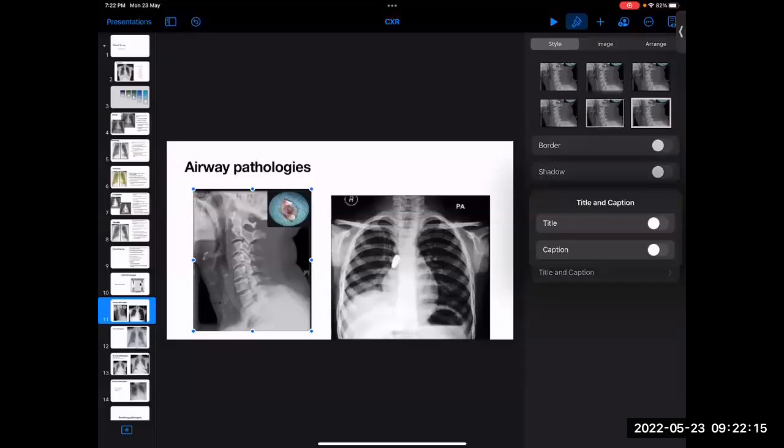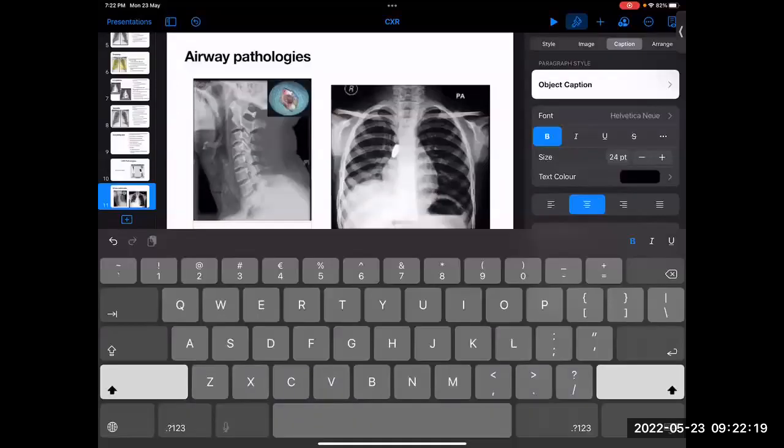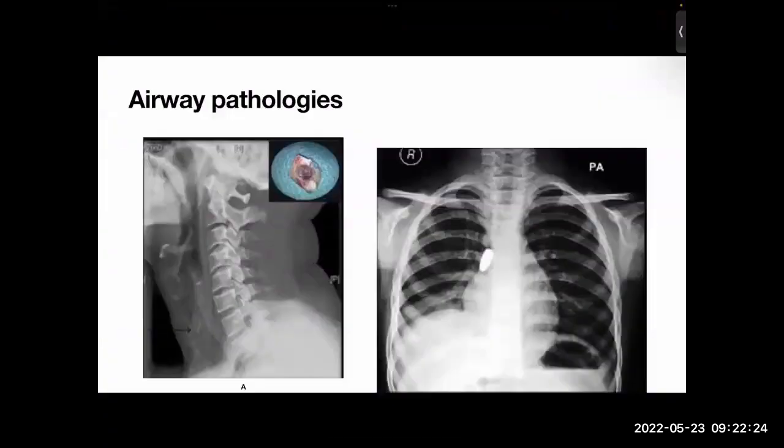Can you take picture A? Yes. Let's start. What is that? What are you seeing exactly? That's not really a chest X-ray. What picture is that? Let's start there. Anybody? Scoliosis or lordosis? Okay, scoliosis. Okay, so let's agree.